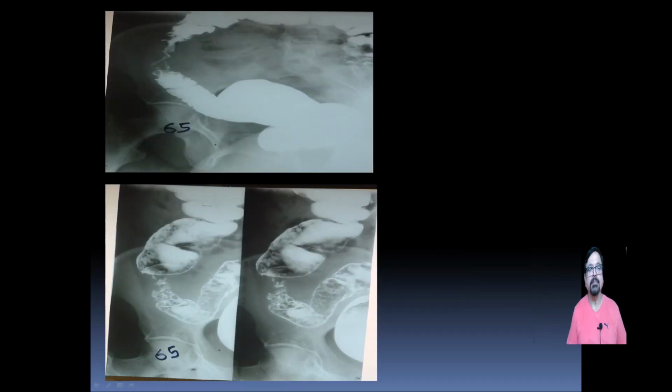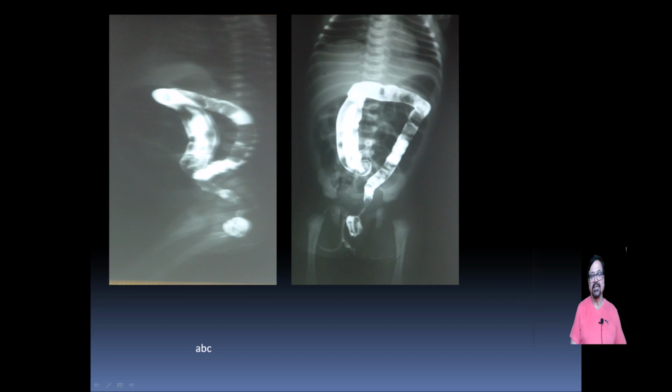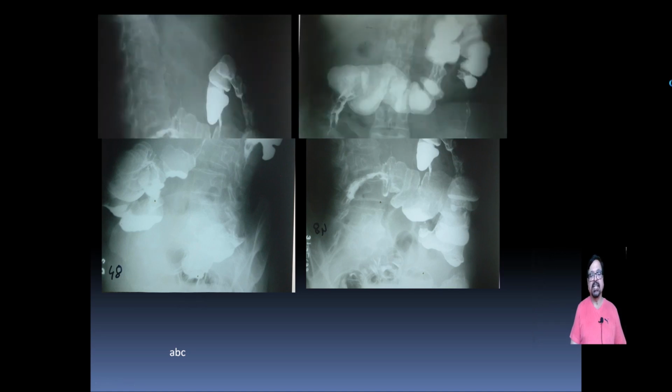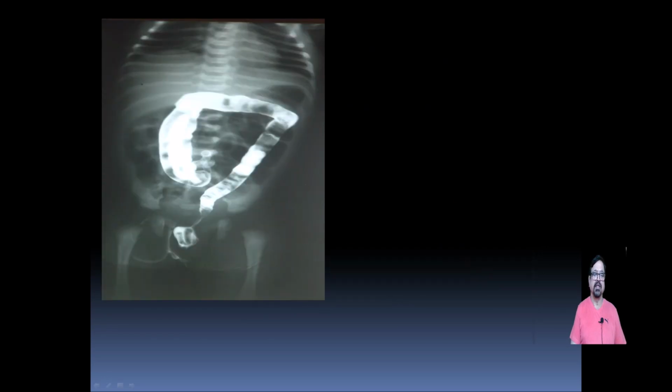Now after the congenital megacolon we are coming again to the malignancies. Different cases of malignancies we are seeing here. There is a non-distending segment, shouldering. This is the long segment Hirschsprung, where you can see that the rectum has a long segment of aganglionic portion with proximal dilatation. Again a case of malignancy, you can see clearly the apple core deformity, then narrowing, again more cases of malignancy, again more cases. Now this pathology we have already discussed, it is congenital megacolon, long segment Hirschsprung. Malignancy, colonic.